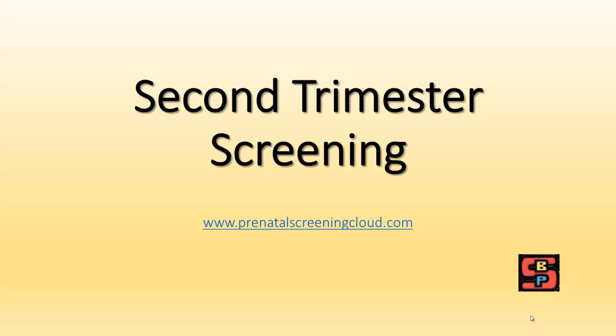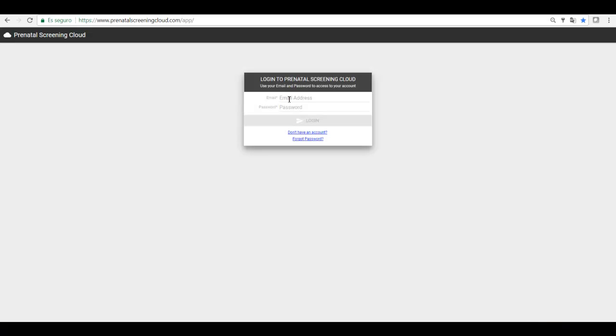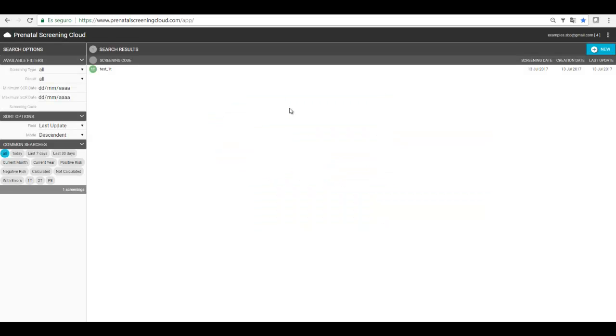Now we're going to learn how to perform a second trimester screening with Prenatal Screening Cloud. In a previous video we have seen how to perform a first trimester screening test, and now we'll learn how to perform a second quarter test. We enter in the app with our email and password provided when we registered.